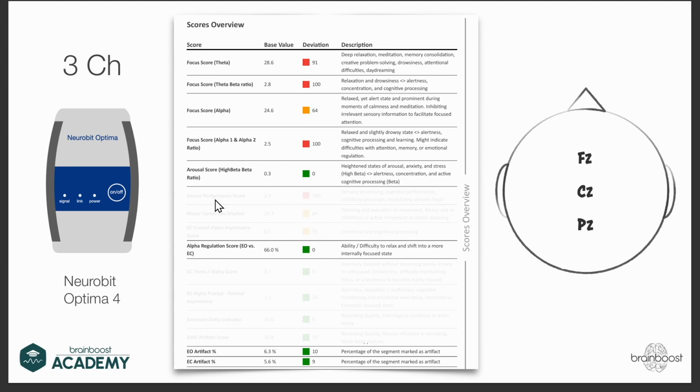Out of the full report, the maximum amount of categories, here you would get the 1, 2, 3, 4, 5, 6, and then you have artifacts, so 6 very interesting categories. So still a lot for a 3 position analysis that you can do.